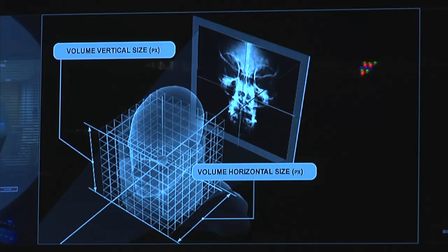No matter what kind of strong magnet you use or what kind of sequence you use on the MR scanner, you always end up with a volume, an image volume, which is constructed by the slices in scan direction. So you can imagine that if you scan your brain, you have like slices going like this in a 1 millimeter distance from each other to get the image cube.